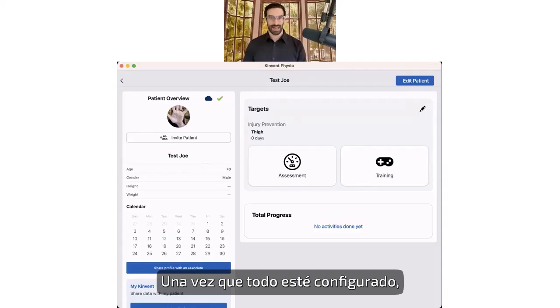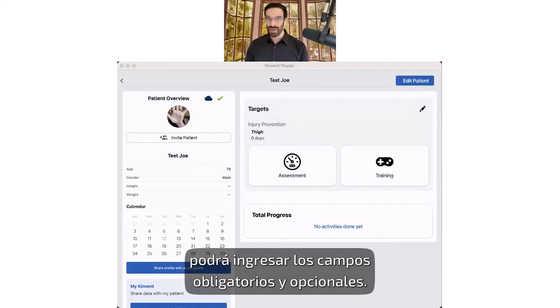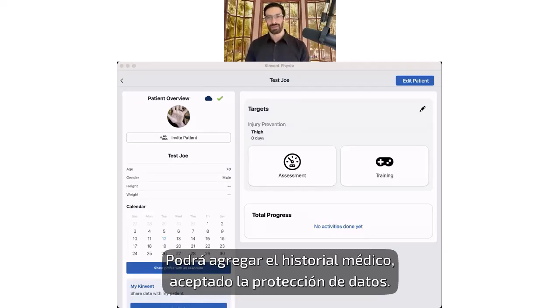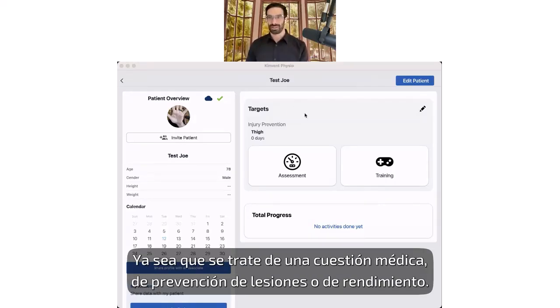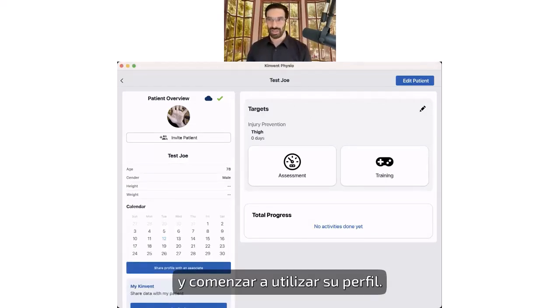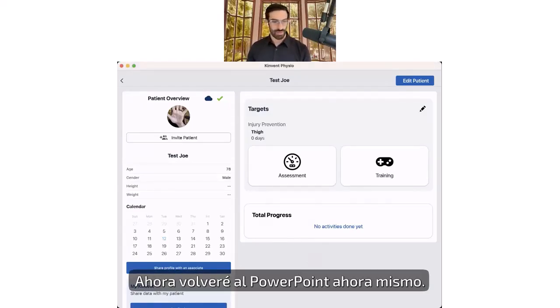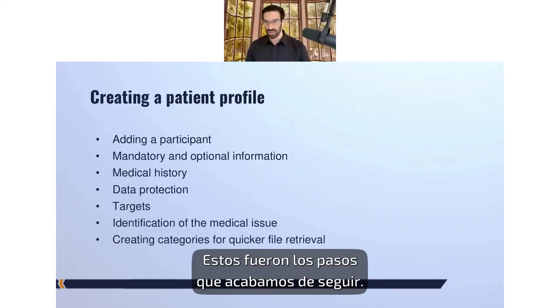So once all of that is set up, you have all the patient information added. You have the mandatory and the optional fields that you can put in. You've put in medical history. You've agreed to data protection. You've identified these targets, whether it's a medical issue, whether it's injury prevention, or whether it's performance. You now have the ability to start testing with this patient and start utilizing their profile. So I'm going to go ahead and switch back to the PowerPoint right now. And these were the steps that we just went through.